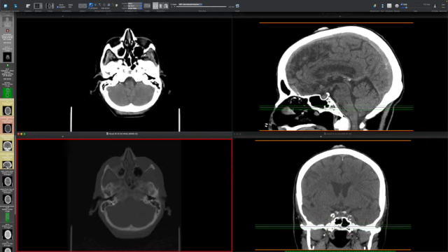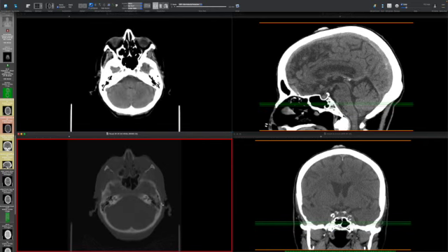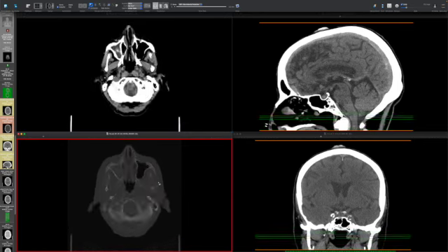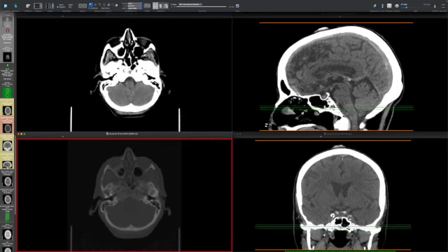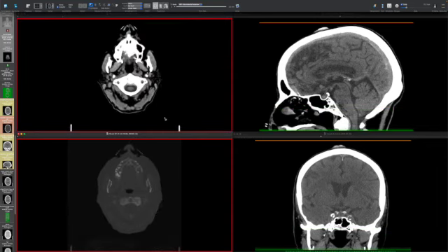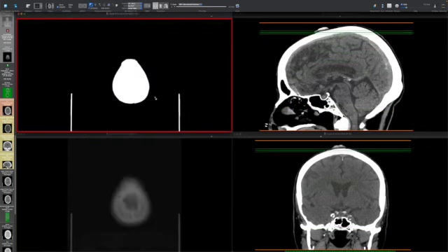And then we can look at the mastoid air cells. These are normally aerated. You can see little bits of the inner ear structures here. Here are the cochlea on both sides. You can actually see some ossicles in the middle ear on both sides. Then we're just going to look at the bony structures of the face, and we're going to look at the structures of the skull base with some of the outlet foramina and vascular pathways, just to make sure that there aren't any lesions. And so then once we get to the bottom, we're basically done.